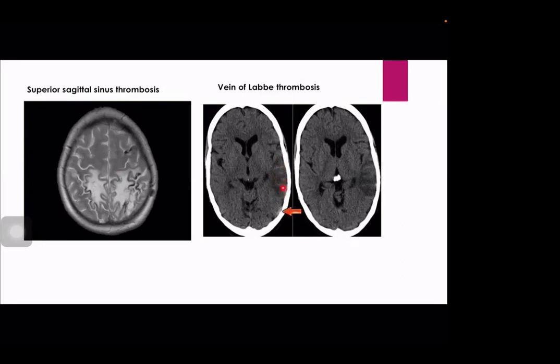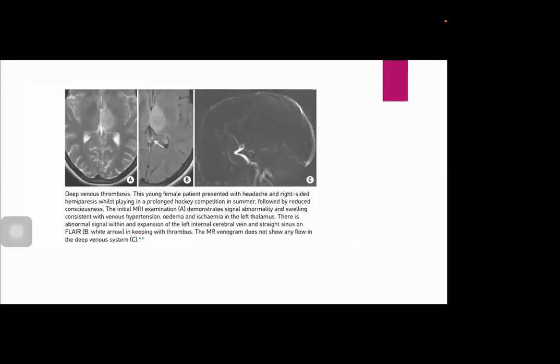So this is a hemorrhagic infarction. The trick to diagnosis here is the hyperdense region of the left transverse sinus, which indicates thrombosis inside the left transverse sinus.